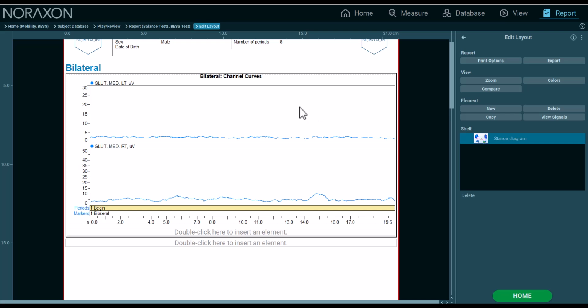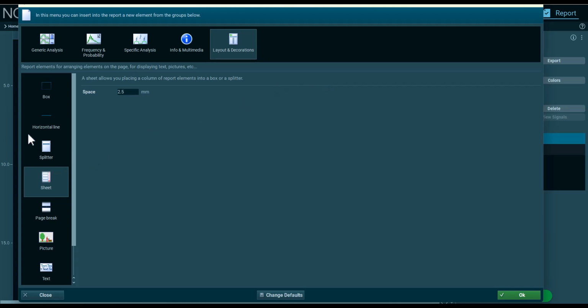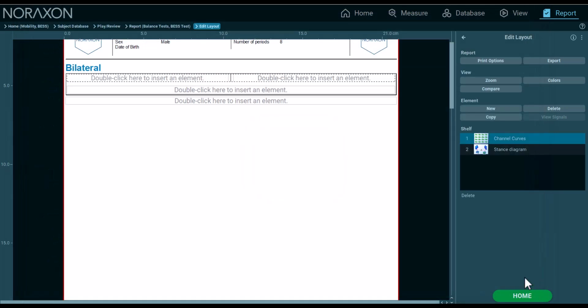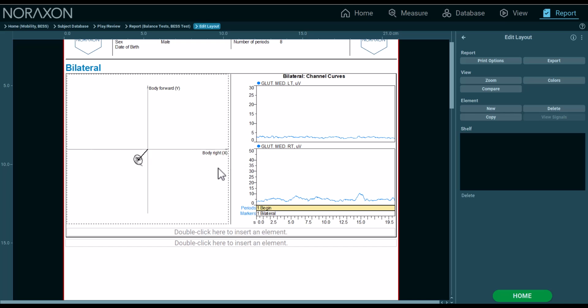So now we can think about adding a splitter, for instance. I can again double click inside this box and I do want to add a splitter inside of this box that splits everything left, right, 50-50. So now I can drag these inside of the box, look for this orange outline here, and now I have both of these elements split. So now I get some good information here. This is a little bit more compact. Starting to really like this layout.